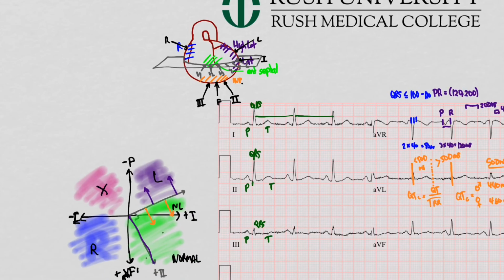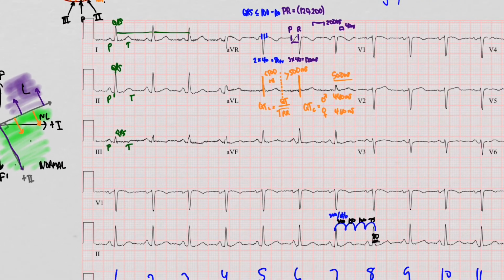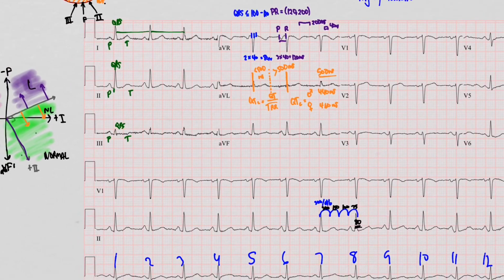Now let's do this looking at the EKG. So let's first look at the inferior leads. Okay, so we said the inferior leads are 2, 3, and F. So these are the inferior leads. So if you see any ST elevations or T-wave inversions, both are kind of some injury patterns, you would look for them. If it's going to hit 3, it should probably hit 2 and F as well, because they're all kind of pointing to the same area.